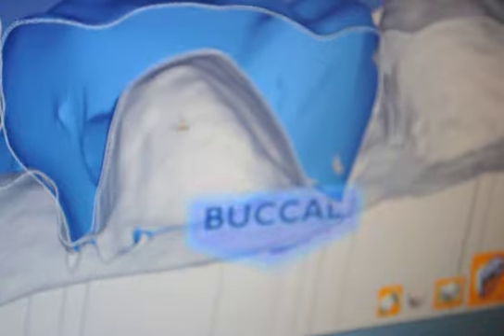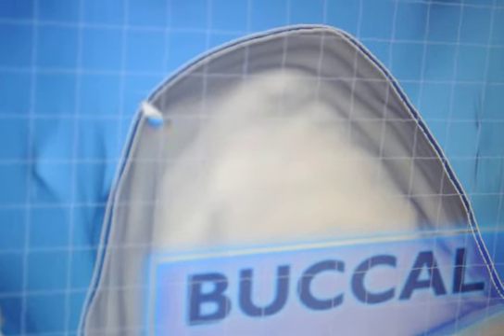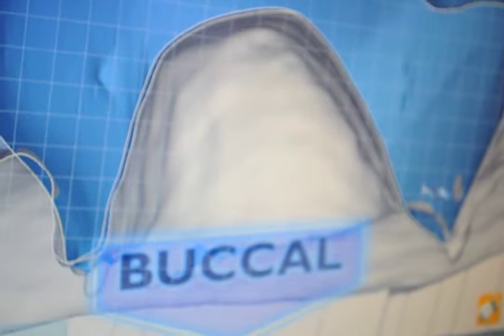And then we can take a cross section, and we can see that the space we allowed for the cement is perfectly even all the way around, and you can do that in any different orientation that you want. And then when you're done, you send it to the mill.